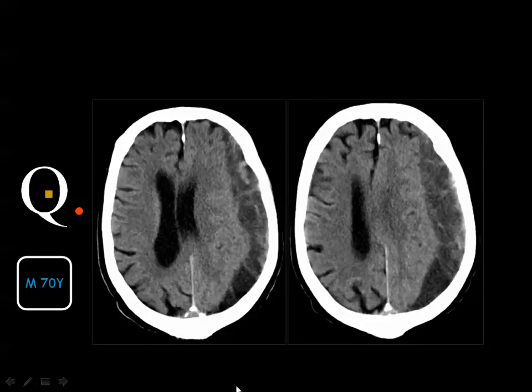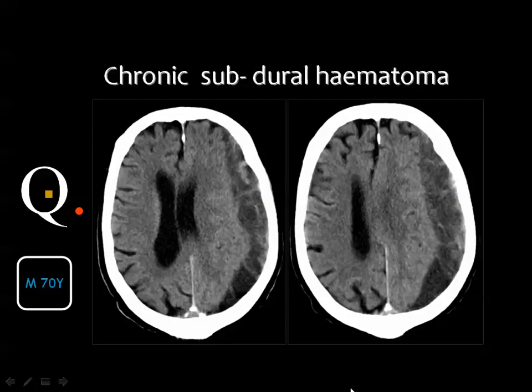Axial CT scan of the brain without intravenous contrast injection showing a large extraaxial subdural, mainly hypodense collection with some internal hyperdensities overlying the surface of the left cerebral hemisphere, associated with significant mass effect in the form of effacement of the cortical sulci, compression of the left lateral ventricle, and contralateral shift of the midline structures, diagnostic of chronic or subacute or mixed subdural hematoma.